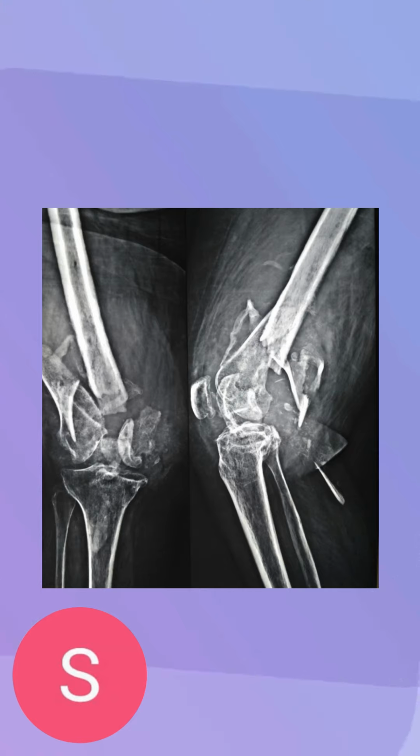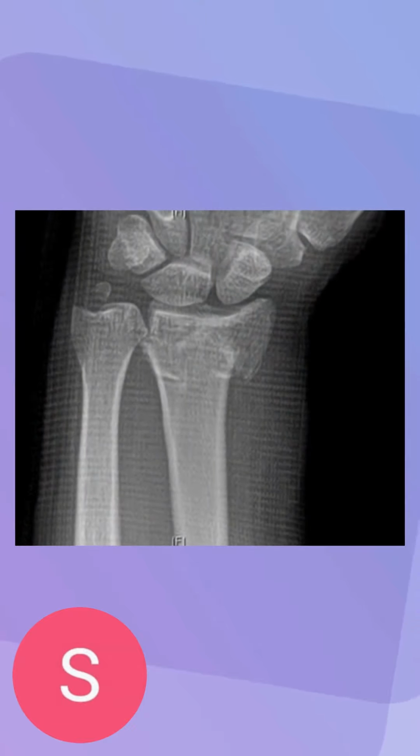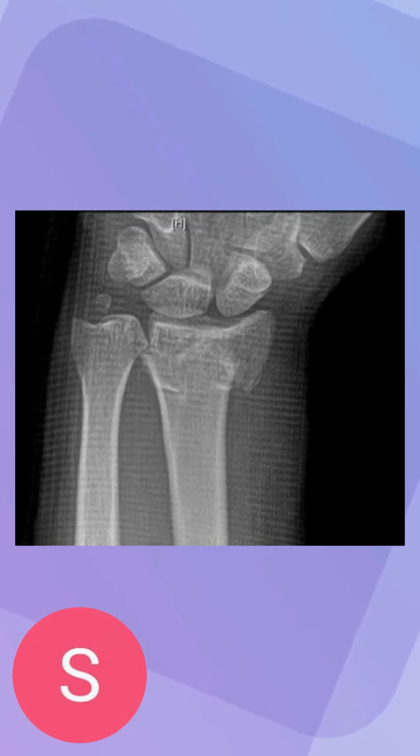I'll go ahead and show you guys another example, and then I'll cover how it gets treated and how it gets diagnosed. This is another image. Over here is a comminuted fracture. It's not as bad as the previous one, but it's still pretty bad, especially since it's on the wrist. Over here we can see a bunch of the bones all over the place, and they're a little bit disjointed. It might be hard to tell based on the angle, but relative to the skin, we can see that they're pointing more towards one direction.